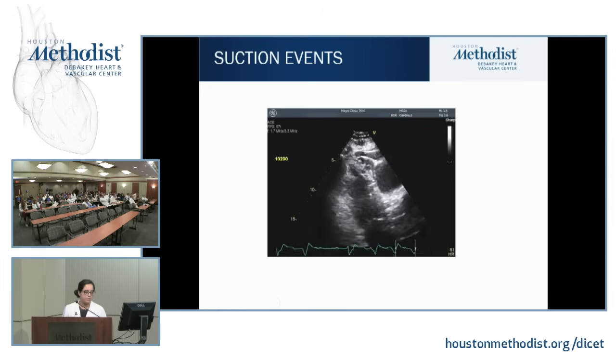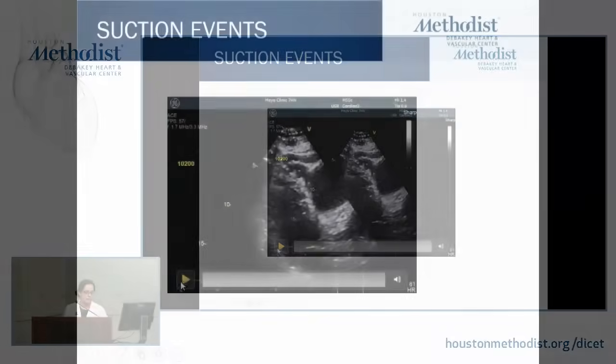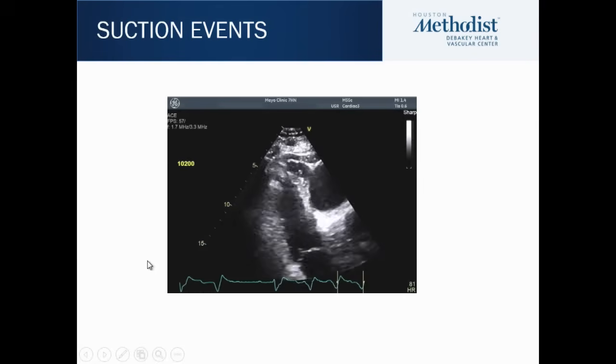So this is somebody, I'm going to play this again. So this is somebody, the inflow cannula is here, and this is the myocardium. It's getting sucked into the LV cavity. This is somebody who came in with VT.